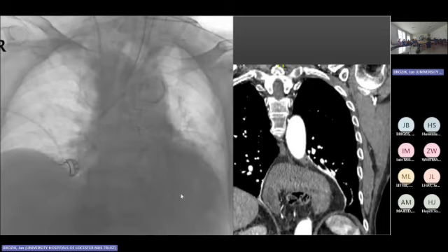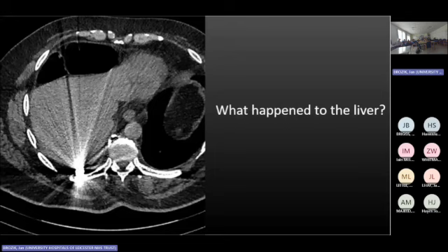It is definitely in the stomach, that happens to be above the diaphragm. Yeah? And somehow we managed to visualize the NG tube mimicking the course of the large airways. So sometimes it happens. So who can tell me what happened to this patient's liver? Anything exploded there, or is it exploding just now on the scan, or what is it? What happened? Who can tell me?